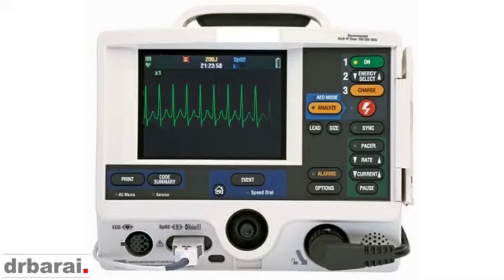To be honest, I don't like the term SVT. I prefer either atrioventricular nodal re-entry tachycardia or atrioventricular re-entry tachycardia. Again, we have different videos to explain what AVNRT and AVRT are. To keep it simple, we can call it an SVT or supraventricular tachycardia, which is demonstrated by these very fast, regular narrow QRS complexes, with no obvious P waves that we can see.